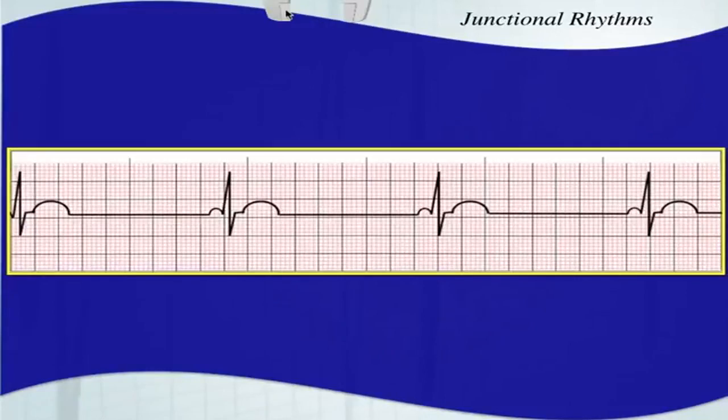Here is an upright P wave, but again, you see that very, very short PR interval. Look at that. It doesn't even exist as far as the PR segment. There's no AV nodal pause. That's because the atria are depolarizing almost at the same exact time as the ventricles with the junctional rhythm. If you're looking at the heart, let's get rid of this for a second.